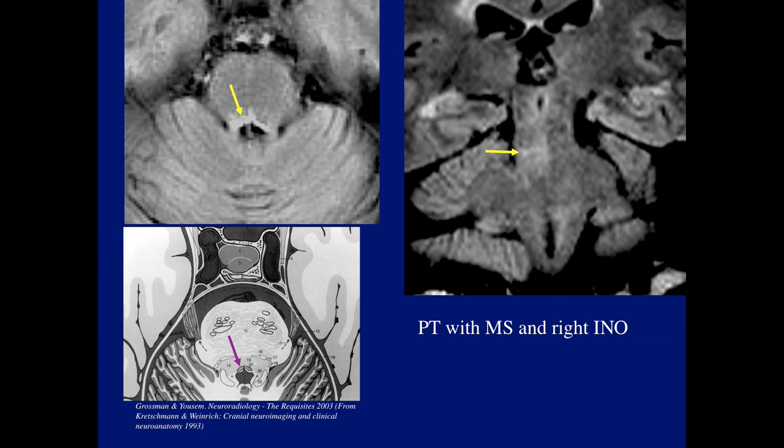Now here's another common cause of INO. This is a multiple sclerosis lesion, again, in the appropriate location for the MLF.